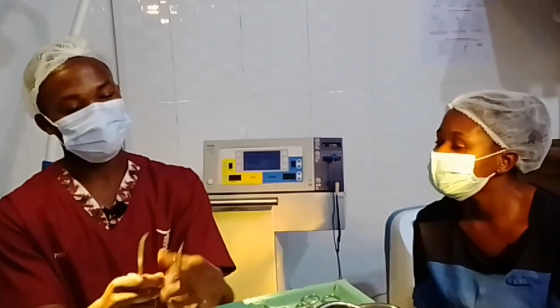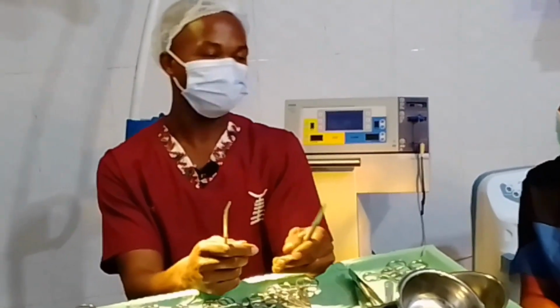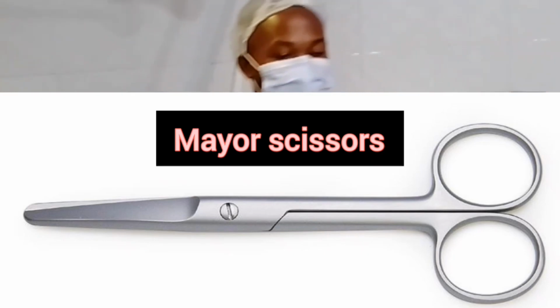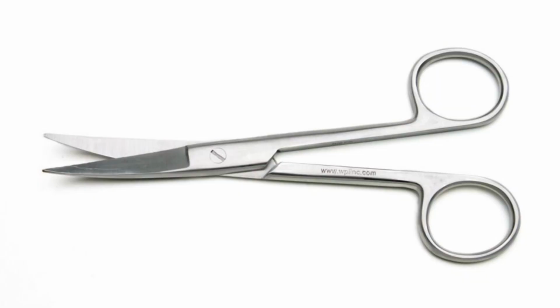We have, this one is Mayo scissors. Others call it, is it the one people call cutting scissors? Yes, another name is cutting or suture scissors. We use it to cut sutures. Okay. Good.